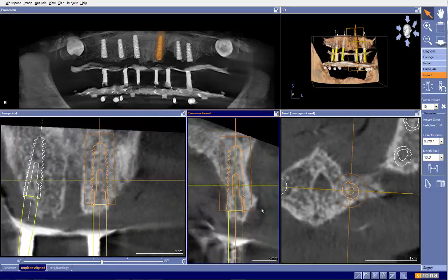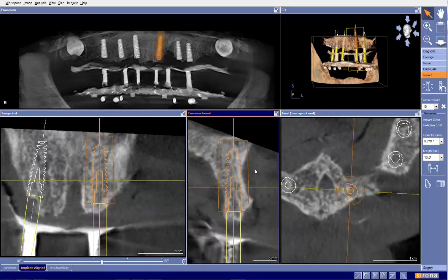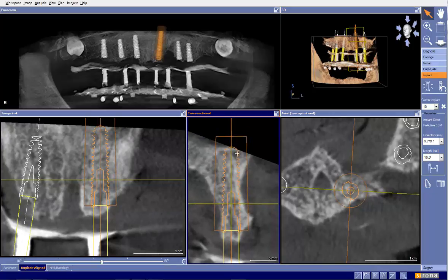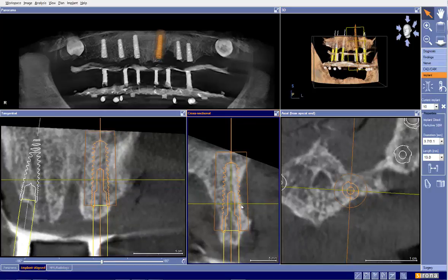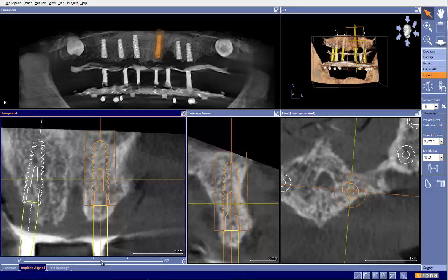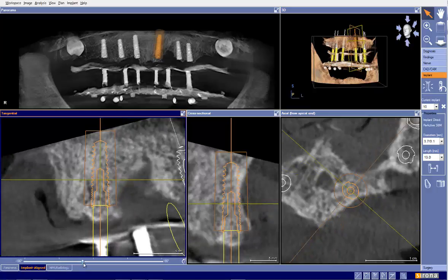And now we have a space where the bone is quite thin and we don't have enough space to accommodate this implant. This area may require grafting, may require a longer implant to gain stability. Again, with the loss of the volume here, we don't know what's going on right here, so we would be unsafe in doing so. So we go back to a 13, and still this looks like it's going to need some grafting throughout that implant, which may create some stress on stability. Yeah, that's just too tight. I would reconsider this site for my implant placement.